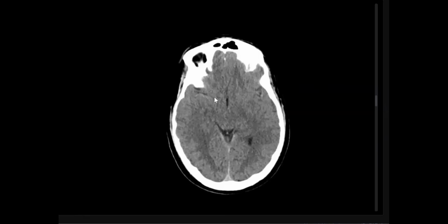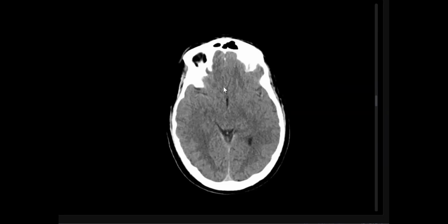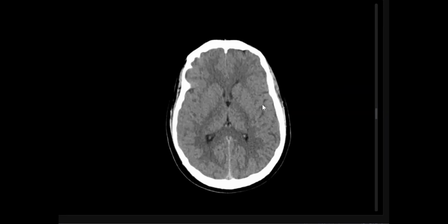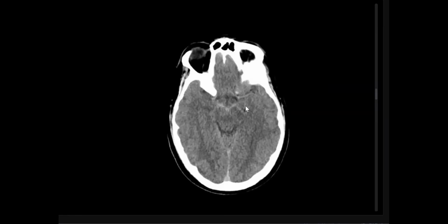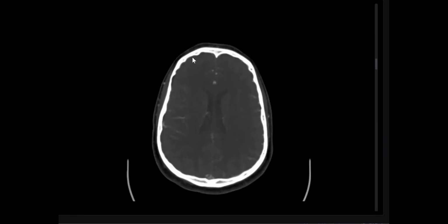So pertinent negative: is it extending along the Sylvian fissure? Is it extending along the interhemispheric fissure or intraventricular? Less likely intraparenchymal. You said no intraparenchymal. This is a good point. But another good point is other spaces, especially Sylvian, interhemispheric, and intraventricular. Why? I'll tell you in a minute.